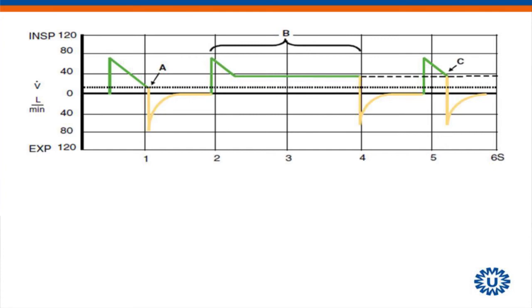Can you tell again what you just told? I said that the trigger threshold is below the leakage. So it means that the flow level will never reach that cycle level, and the inspiratory time will last for the inspiratory time set on the ventilator.